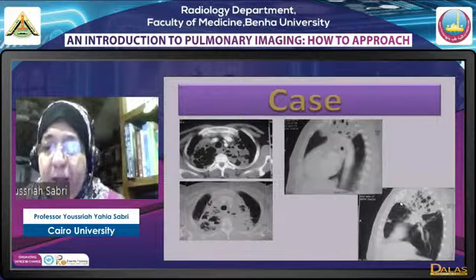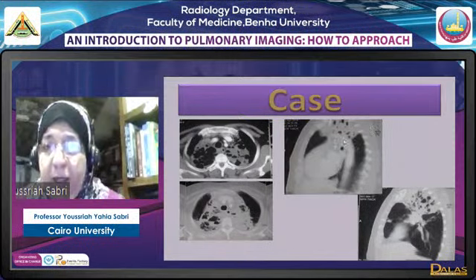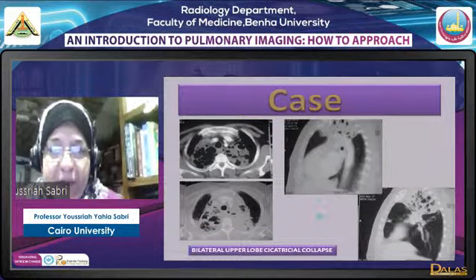In the right lung, it is demarcated anteriorly and posteriorly because we have minor and major fissures, while in the left lung, it is demarcated only posteriorly because we don't have a fissure between the left upper lobe and the lingula. Okay, so upper lobe cicatricial collapse.